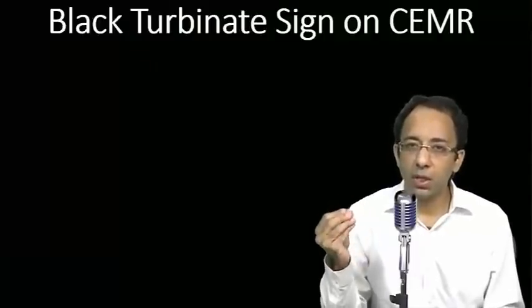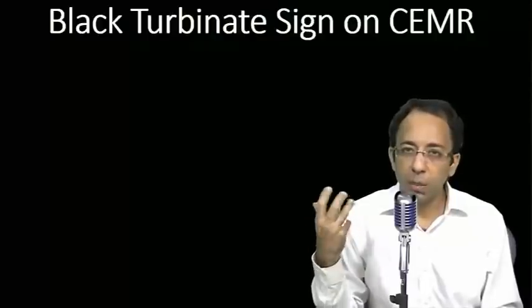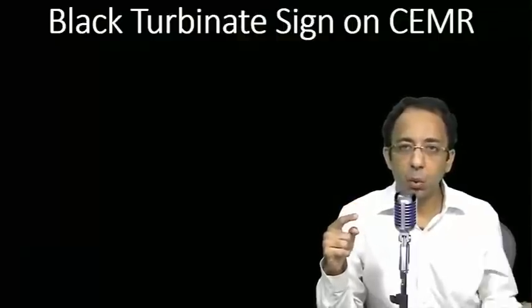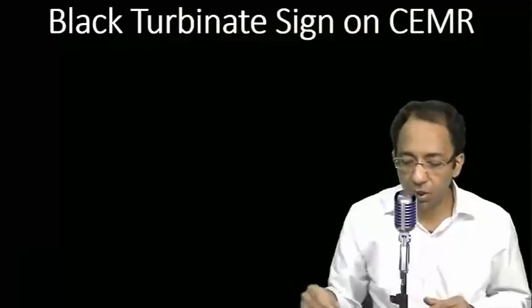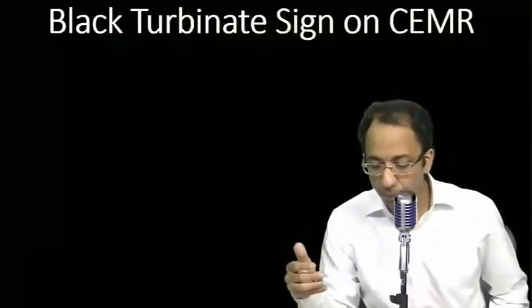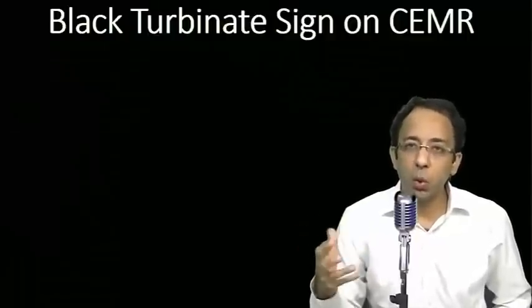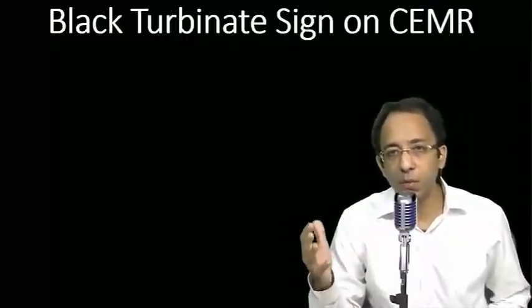When I give IV contrast, the normal mucosa on the turbinates would enhance, it would take up the dye. But if you remember, in the beginning of the class I told you that mucor is angioinvasive. Because mucor is angioinvasive, it leads to, tell me, anybody? Infarction. So the dead tissue, the necrosed gangrenous tissue, will not take up the dye. So you'll see the turbinate will appear dark.